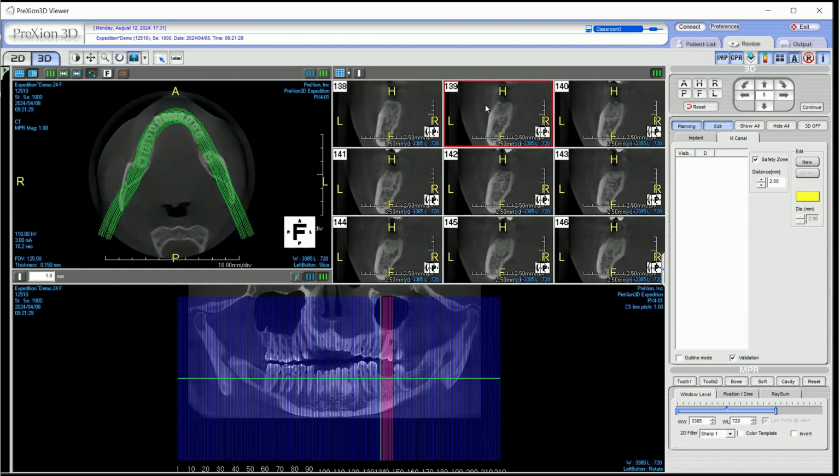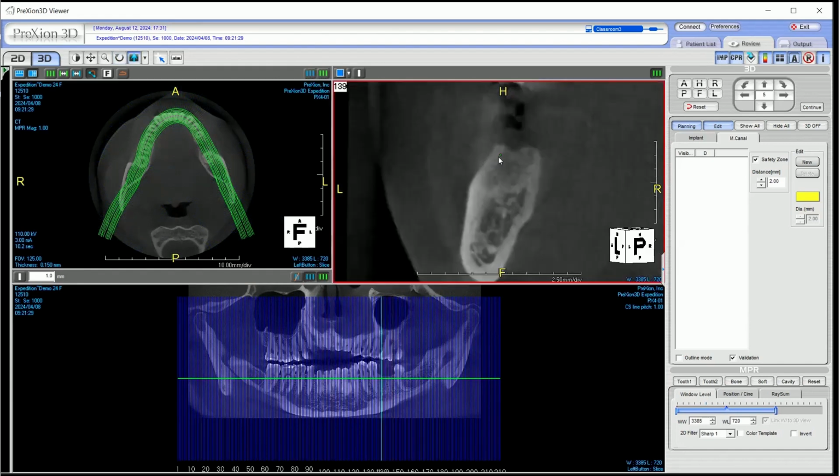If you wish to get rid of the dot in your frames, that is a representation of the CPR curve or horizontal line. That's going to be the icon in the upper right area of those frames.